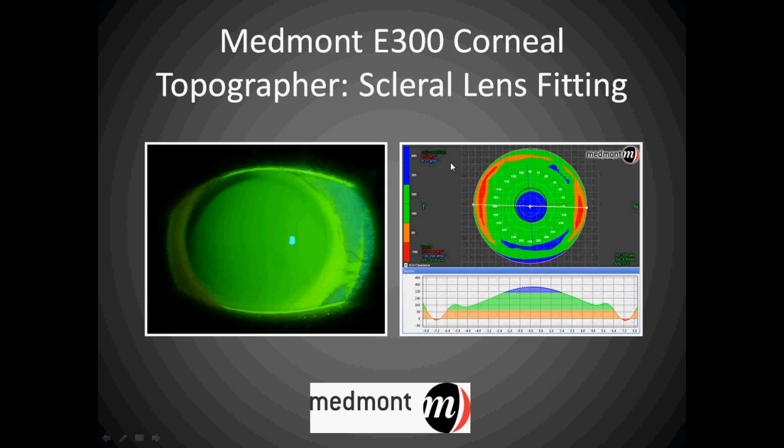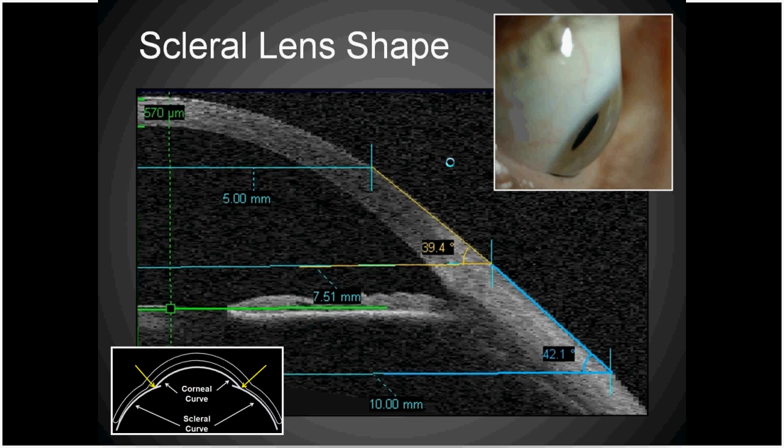This video describes the fitting of scleral lenses using your Medmont E300 corneal topographer and the Scleral contact lens fitting module within your software.